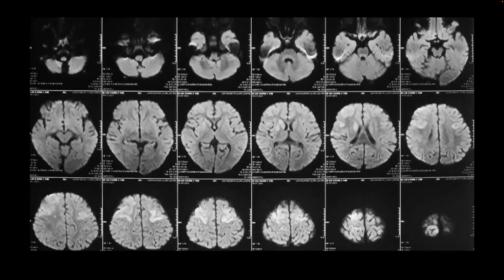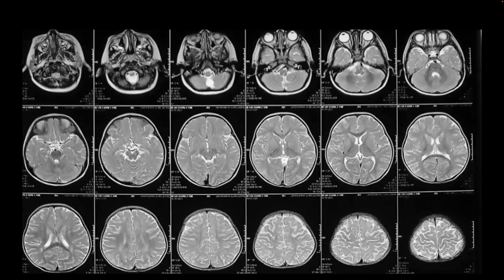So the primary changes were areas of cytotoxic edema in the bilateral frontal lobes and also the right basal ganglia, and possibly a focus over there in the periventricular region on the right side. Again, slightly blurred images, corresponding T2 sequences. Nothing new to add than what we have seen on the diffusion weighted sequences. So bilateral subacute ischemic changes in the frontal lobes and also involving the basal ganglia nuclei. So based on that, I don't have the angio or any vessel wall images.